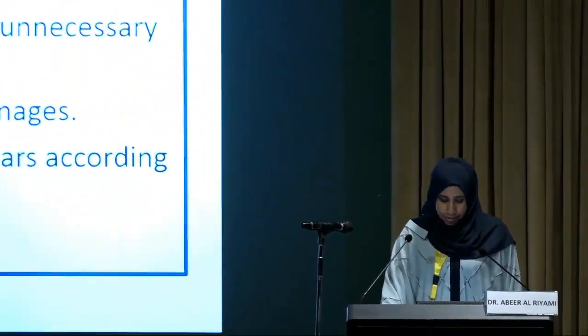Good afternoon, everybody. In the next 20 minutes, I'll be talking very briefly about the normal meniscal anatomy, the normal variants that can mimic meniscal tear, pitfalls which can form a pseudo tear appearance, and the types of meniscal tear and their MRI appearance. The aim is to recognize the normal anatomy and the anatomic variants in order to ensure diagnostic accuracy and to prevent unnecessary surgery.